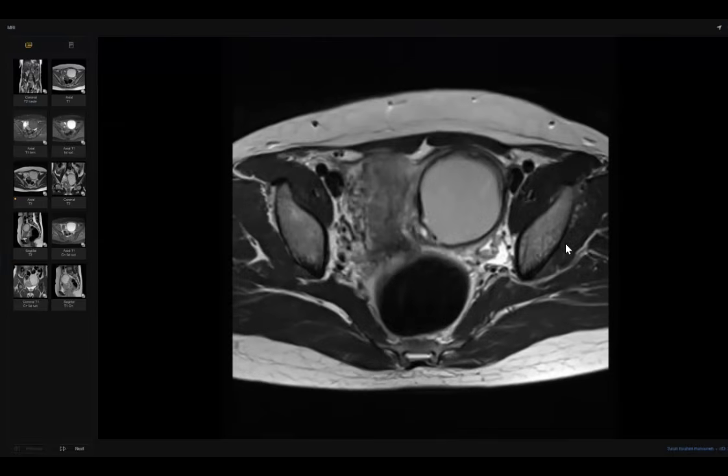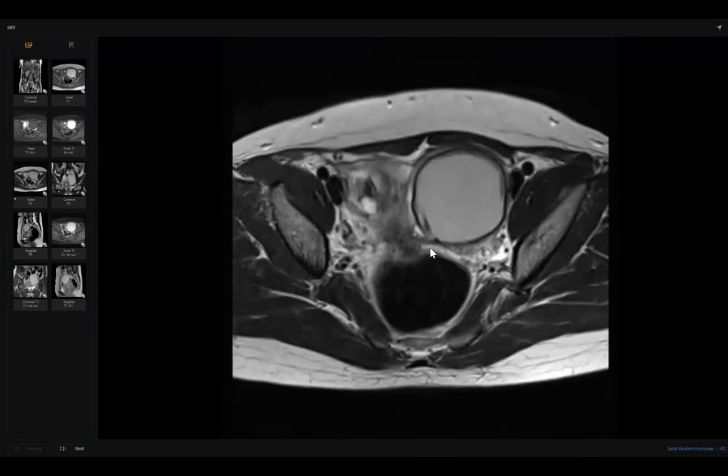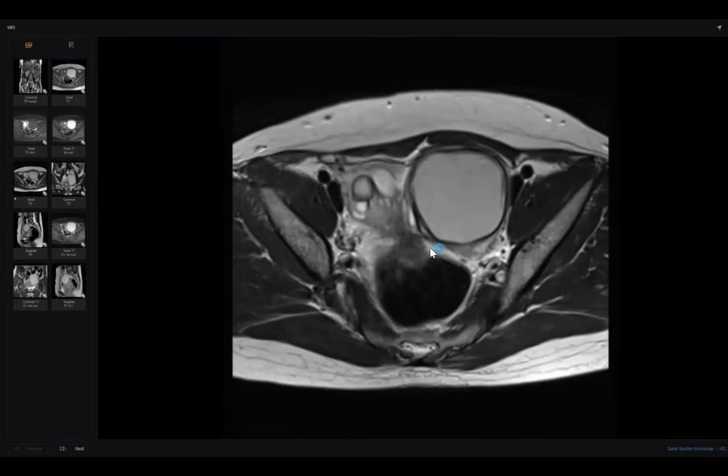Here I can see the tethering, at the junction of the bowel and the uterus. So this can be an endometriotic deposit. What is the name of this sign? Mushroom sign, maybe, when there are deposits at the junction. Mushroom sign is not seen in axial specifically. This sign has another name. Tethering. What is the name?